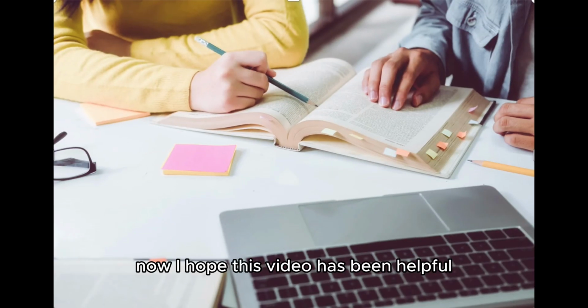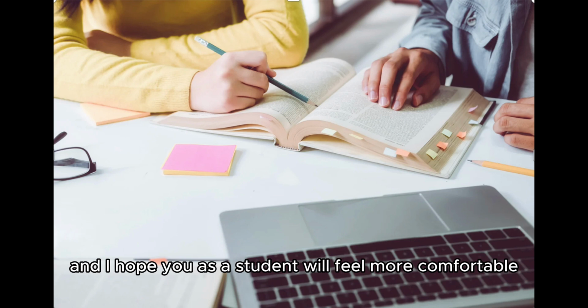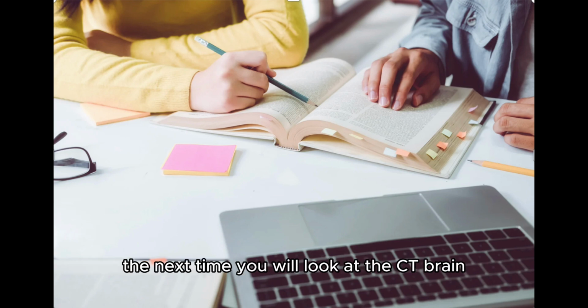Now I hope this video has been helpful, and I hope you, as a student, will feel more comfortable the next time you will look at the CT brain.